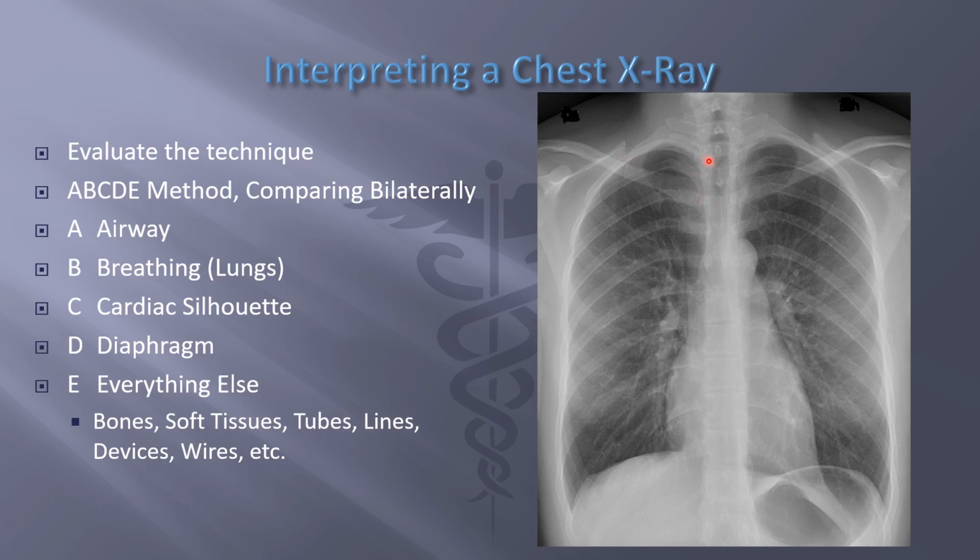The clavicle is down about 3 or 4 ribs here, so that's good. So this was shot perpendicular to the film. So technique-wise, this is a good film, so I can move on with the rest of my evaluation.